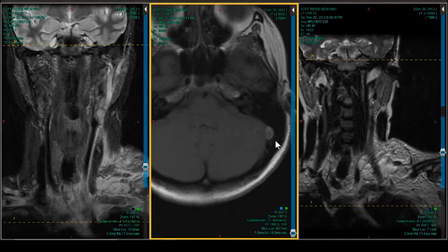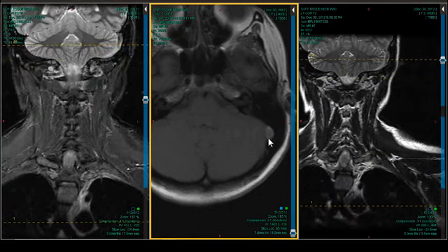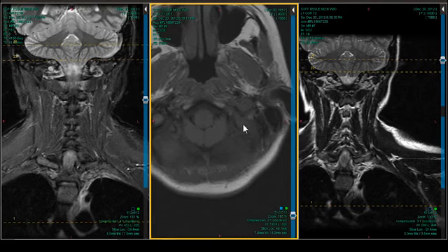What do you think of the lateral sinus on this one? Yeah, it's out. Lateral sinus is out too? Yeah, I'm pretty sure. Let's see. I think so. I think you're right. There's the sigmoid sinus right there. That's out. That's nice and gray.